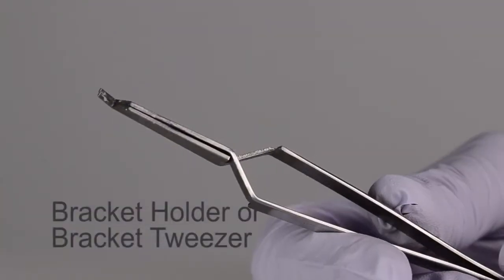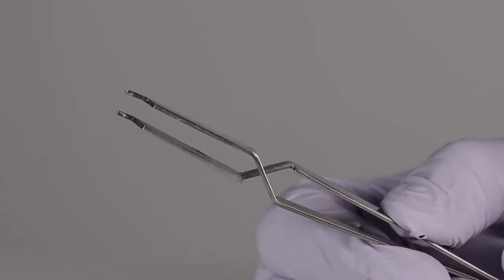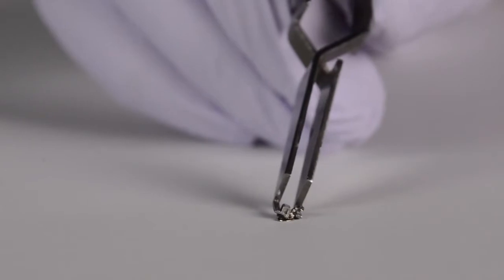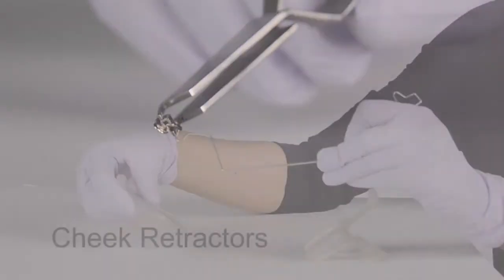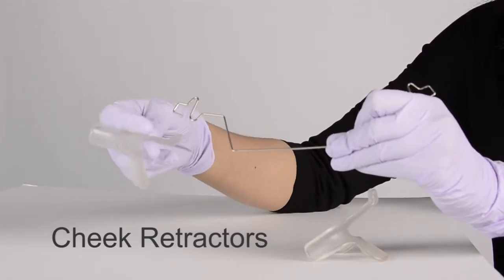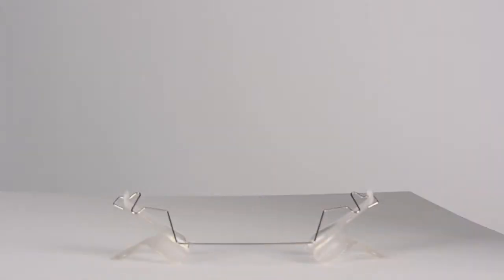A bracket holder, or bracket tweezer, is a reverse action instrument with two fine angled tips used to hold and place orthodontic brackets. A cheek retractor is used to move the cheeks away from the teeth to allow for visualization and isolation of the treatment area.